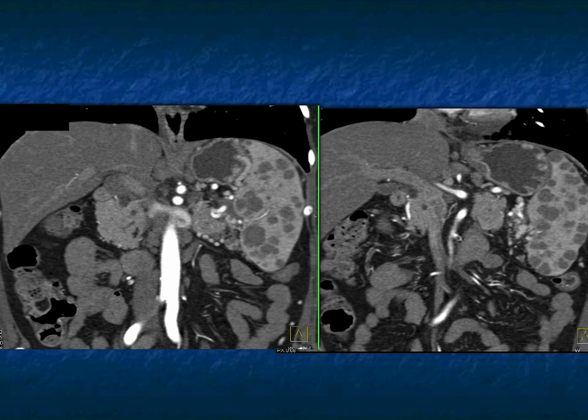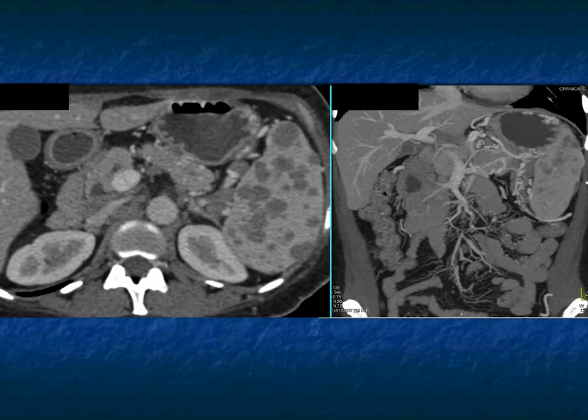Commonly, I will see hepatic and splenic, and someone's going to say lymphoma or melanoma, and that's the way you should be thinking. But sarcoid is a challenging diagnosis, and in a patient with no history of anything else, patient had trauma, so this is really incidental in a sense. You got to think about sarcoidosis before you go down the rabbit hole of metastatic disease and the patient seeing the oncologist.